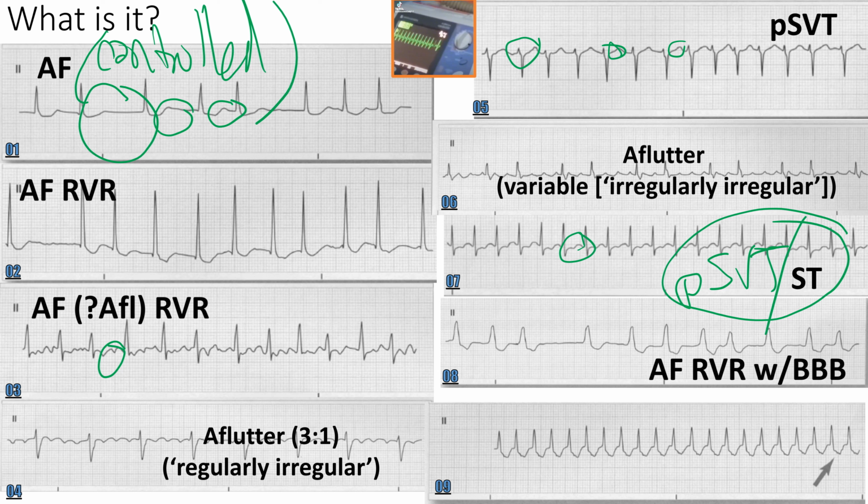So that's why doing a 12 lead is important for this patient. Everybody knows what a 12 lead is, right? A 12 lead is a formal diagnostic test we do to make sure that what we're seeing on the bedside monitor is what we're seeing. Okay. All right, and then next one, number 9.